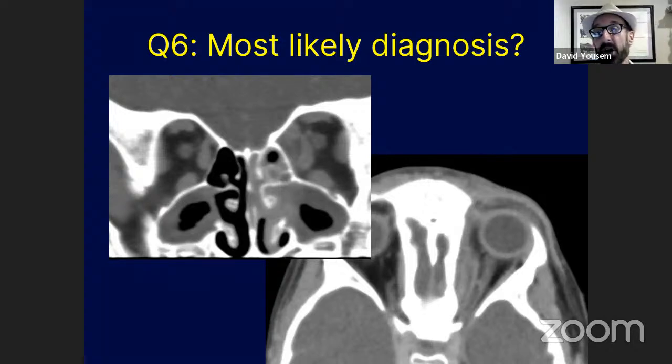With these collections, we call them subperiosteal abscesses even if we do not see peripheral enhancement. So this is one of the locations where we would still use the term abscess, even though on the post-contrast scan, you don't see a walled off collection with peripheral enhancement. Most of the time nowadays, these lesions are treated with intravenous antibiotics and close observation in the hospital. And if it does not quickly resolve, then they usually are going to treat the sinus disease endoscopically and try to address the primary infection that's causing this problem.